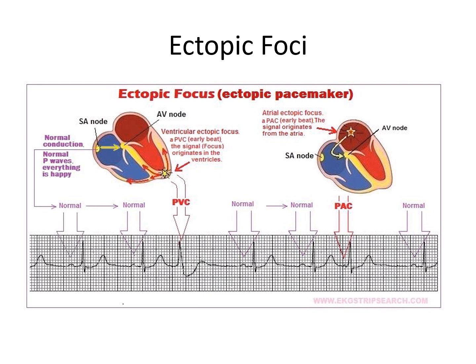And in this slide as well, we see a representation of ectopic foci. Here, ectopic focus would be one versus foci, which is more than one. And we also see the term ectopic pacemaker. So we see all kinds of words related to the same phenomenon. And you'll see here that the area in the yellow star shows the ventricular ectopic focus. When that area gets irritable and initiates an impulse, it produces an early beat. It's a premature ventricular contraction. So even the PVC exists because of an ectopic focus.